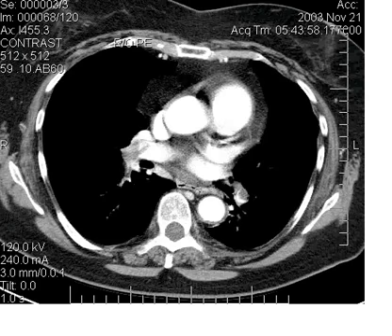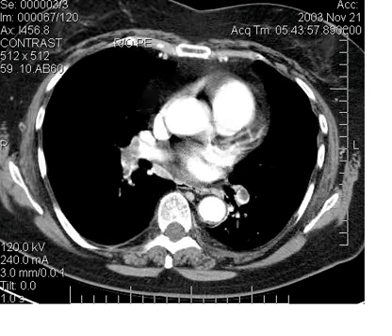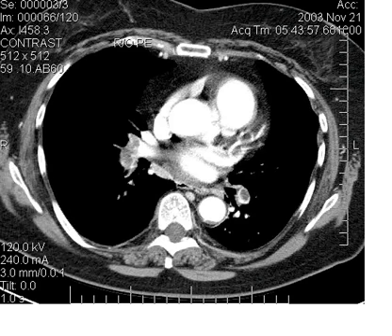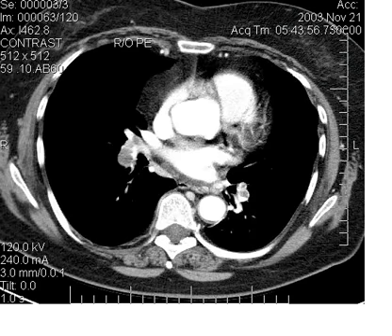Okay, and you'll also notice, if you're wondering what you're seeing is real, almost every case you see is going to have a tubular or cylindrical kind of appearance. All of these clots, of course, are casts that are formed in the deep venous system of the legs, and therefore they are tubular or cylindrical structures, and you can appreciate that detail, that characteristic on almost every study.